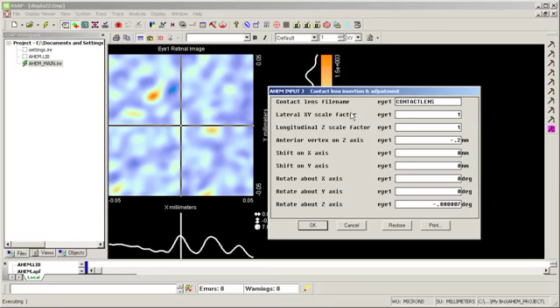So you can create a contact lens in some other CAD application, or you could create it within ASAP. So I created a contact lens within ASAP. Have a scaling factor that I can use. I can make it larger or smaller. I can reposition the anterior vertex. So I backed it off the front of the cornea in this case because the anterior corneal surface is Z0 for the entire system. So I have to go negative to back it off the cornea just a little bit.